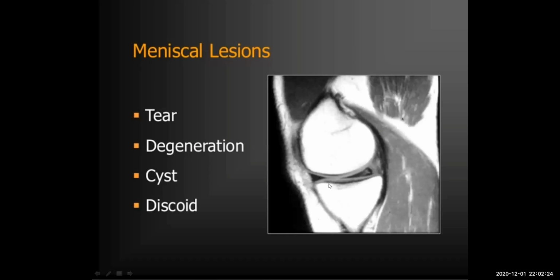Now here we go with the meniscal tears. We started with the anatomy of the medial meniscus. Then the types of tears: usually there are many, but in general we can divide them into traumatic tears, where we stress on that, and the medial meniscus has a secondary stabilizing role. If there is an ACL deficiency, it usually becomes the primary stabilizer, so it will be at high risk of having this kind of tear.